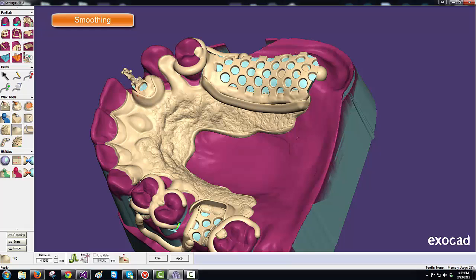It's a great tool, and increase the size of it with plus and minus key, or control holding down with the scroll wheel on the mouse. If you see any holes you want to reopen, then you can use the smudge tool, set the area of influence to the right power that you want, and just remove any wax that was placed in those holes from overlapping.